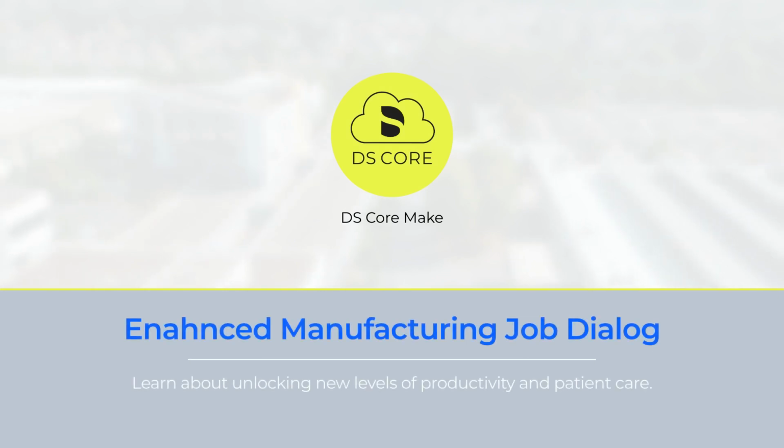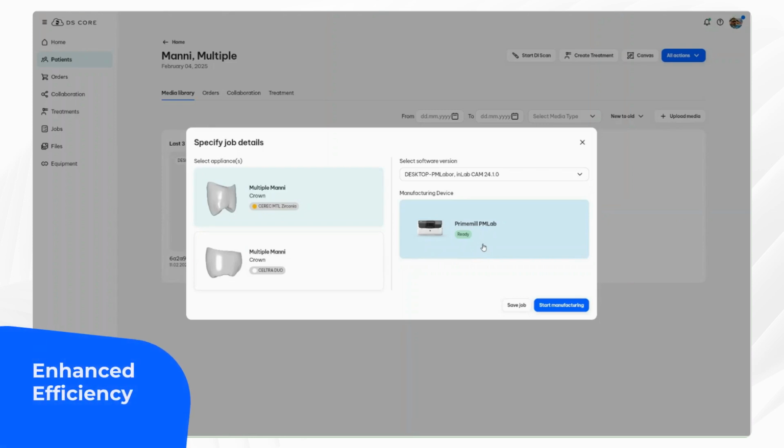In this tutorial, you will learn about enhanced job dialog and how it supports you in elevating your practice's efficiency by unlocking new levels of productivity. The enhanced job dialog is our latest improvement to our manufacturing capabilities on DS Core.